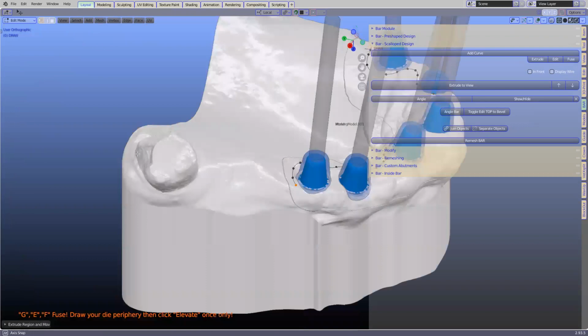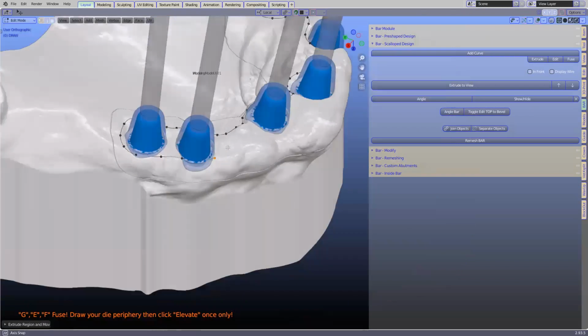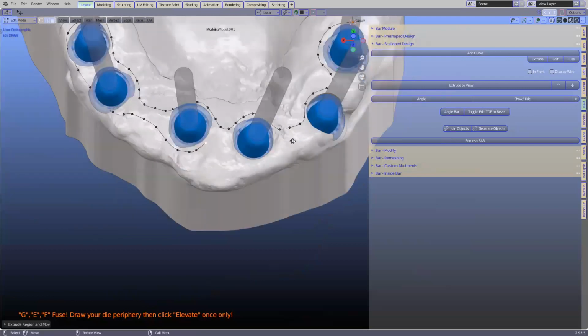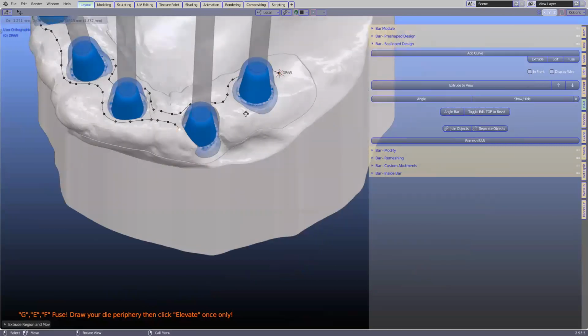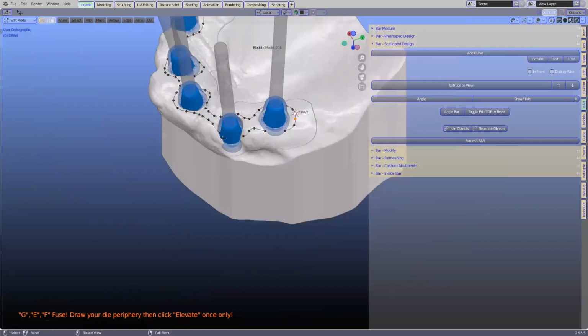Very different, looks different. Yeah, let's just bridge over there like that. So it divots in and out. Here, let's just go like that, and we're going to go right across like that, and maybe across like that, like this. Okay, we're going to look at it from the top.